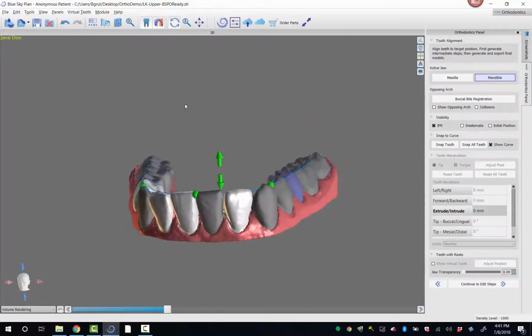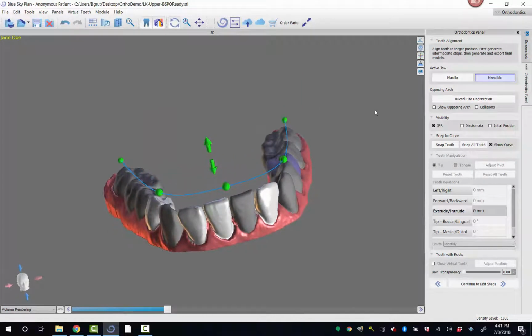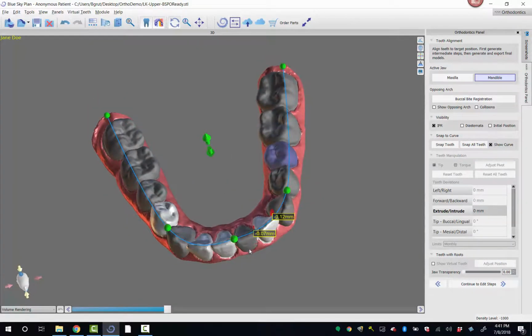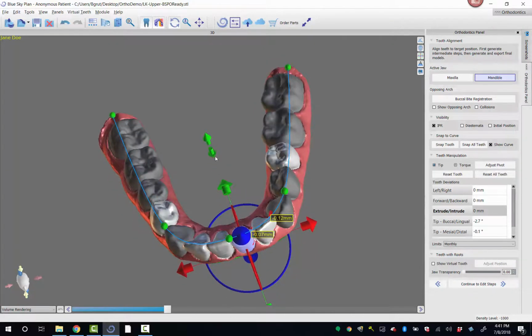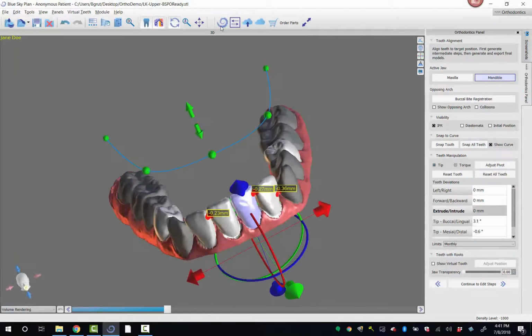Okay, pretty straightforward, pretty convenient. If you change the height of this, I don't do that in most cases, but it will affect things kind of trying to retract even more because it's lining up the pivot of the tooth, which is this guy right here. So moving the curve higher and higher does not actually move the teeth higher.